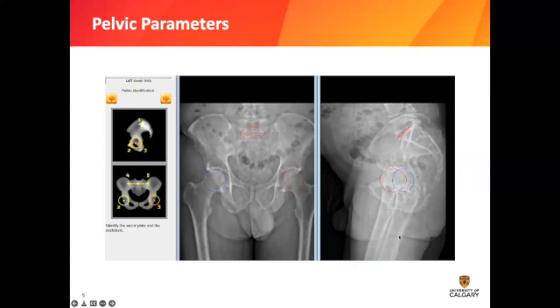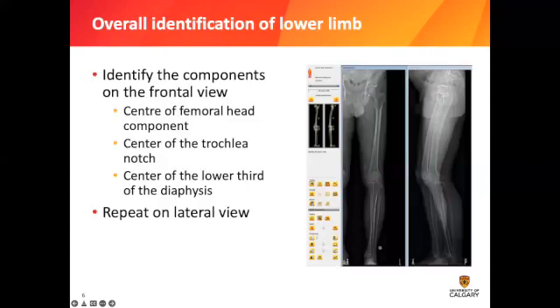So in that case, we know that the bone that will be slightly wider is going to be our left bone. So in this case, the red marker for the left should be along this bone, and then the right one should be for this one. Our additional steps for this stage include also identifying the acetabula, which is right here, and this will just landmark for the rest of our steps.